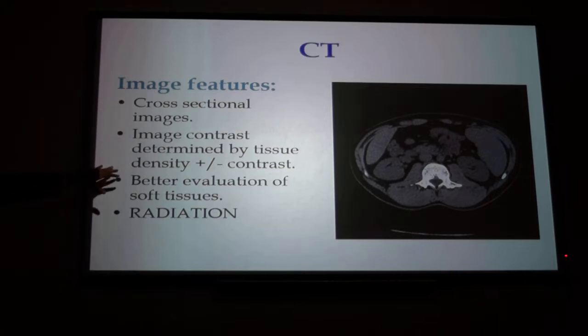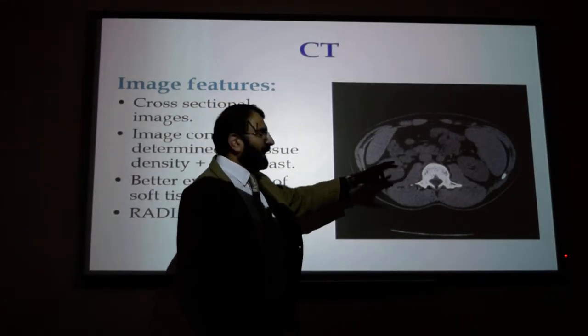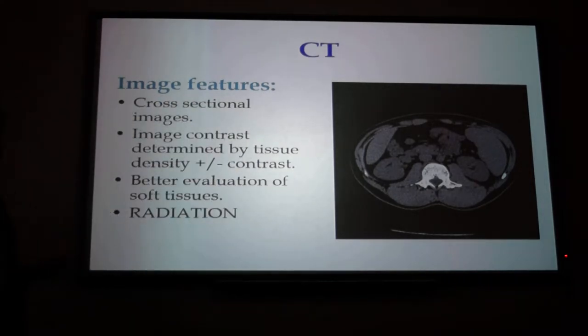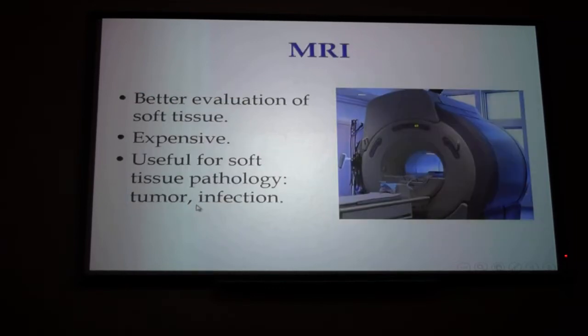So a plain CT scan is something like this. There is no contrast given. Why do we do plain? We want to see the stones because the stones appear bright. But remember, the drawback is more radiation compared to X-rays.